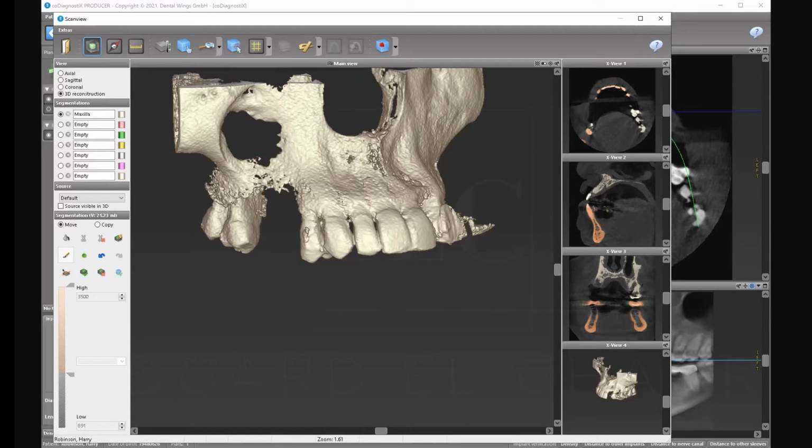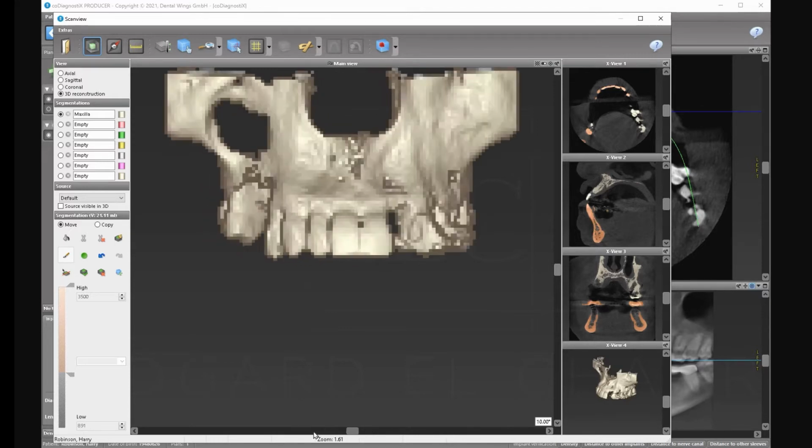So you can try to remove the scatter, and for instance, I secluded it like this. I go back to the bucket and I press on this and it takes it out. So if you have a big piece or you are segmenting to take the bone, you can do that. I don't like it much, because I'm faster like this than the other one. So now I go back to the other side.